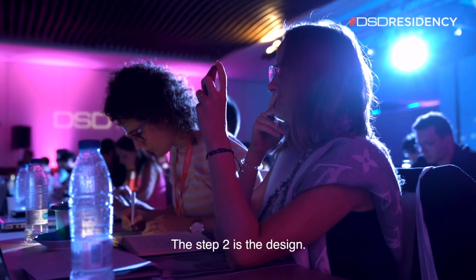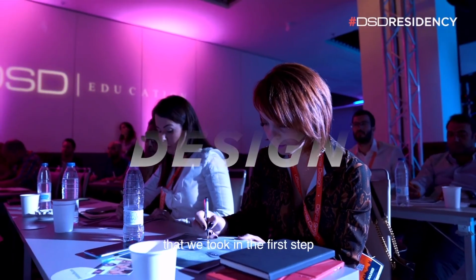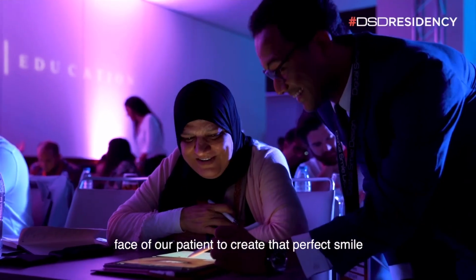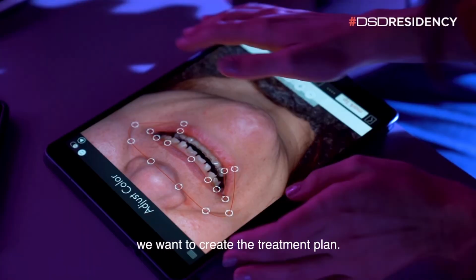The step 2 is the design. We need to use all the information that we took in the first step and start to create the lines, the smile frame, following the face of our patient, create that perfect smile, and then following this design, we want to create a treatment plan.